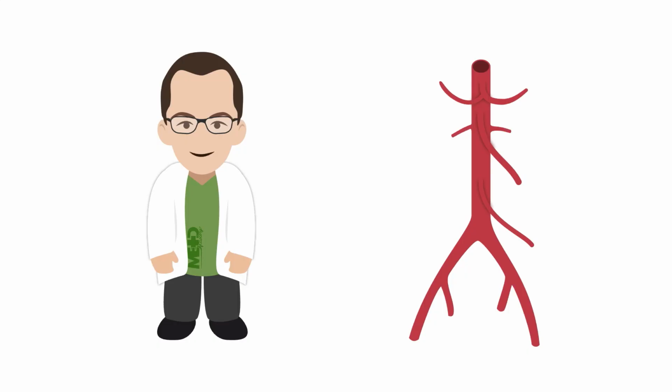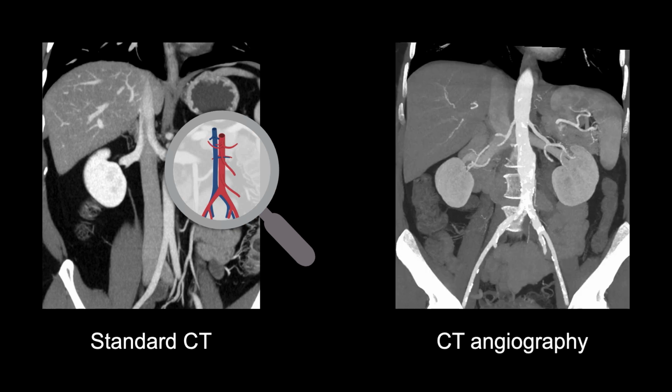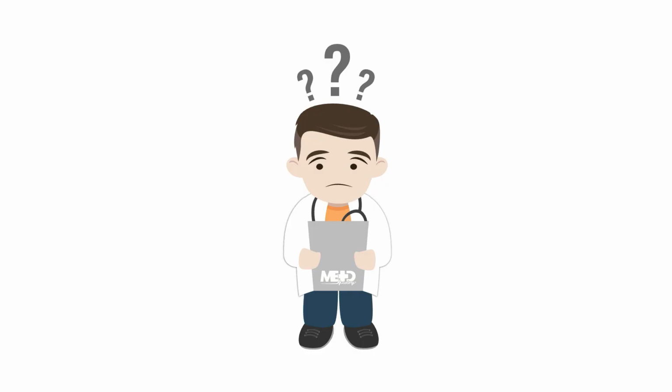In this mid-mastery lesson, we will focus on reviewing the key abdominal and pelvic arteries to ensure that they are open with normal blood flow. On a standard portal venous phase CT, you will get a balanced view of the vasculature that includes both major arteries and veins, whereas an examination such as CT angiography obtains images earlier after contrast, which allows you to see even small arterial branches. At times, it can be tough to confidently evaluate the vasculature.